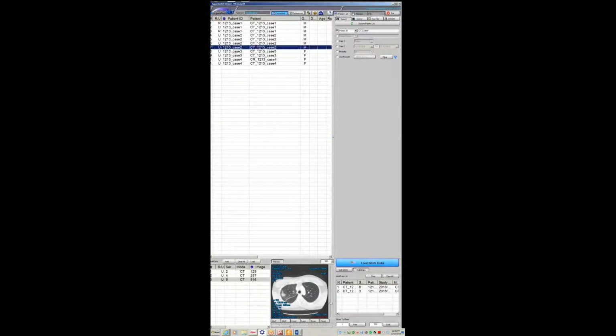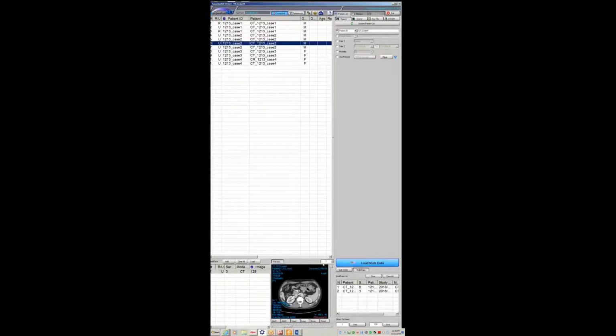It just was really shocking to see that expiration go completely to nothing. That is interesting. But it's definitely smoking related. Emphysema. Sorry. It's definitely smoking related kind of emphysema, regardless. Right. Yeah. But it's just emphysema shouldn't.